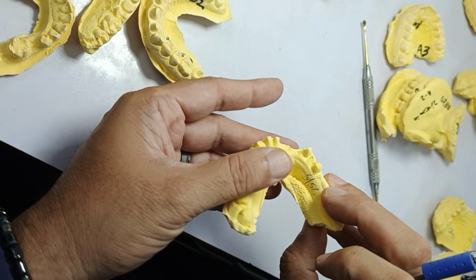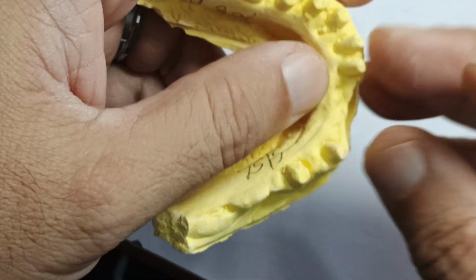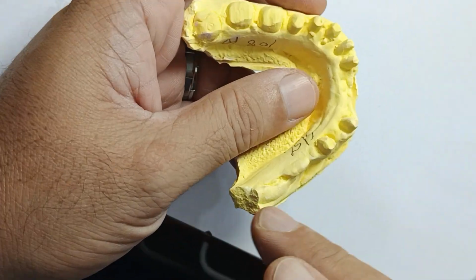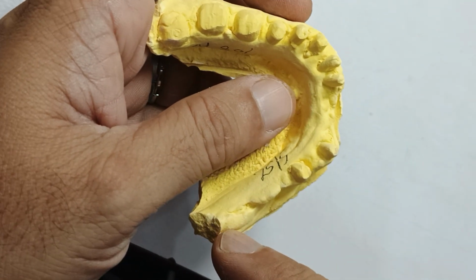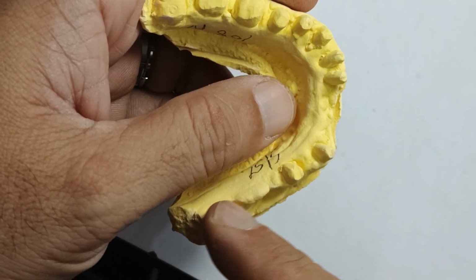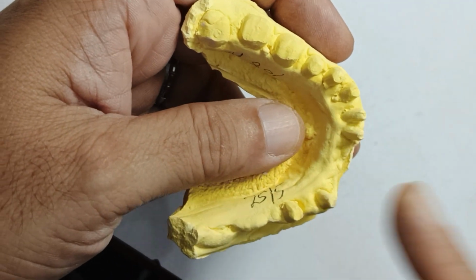Here. Look at this. Okay, let's say somebody wanted to do a bridge. Why would you do this? All the teeth are cut, so you can give fixed teeth. Sometimes it's a good idea to reject the patient and say, I'm not going to do haram. You need a partial or an implant back there. But every single tooth is cut horribly.